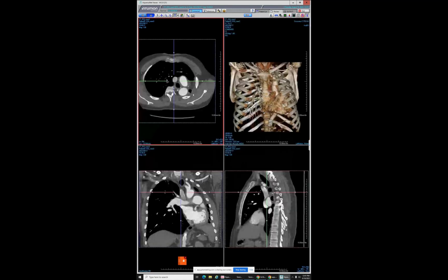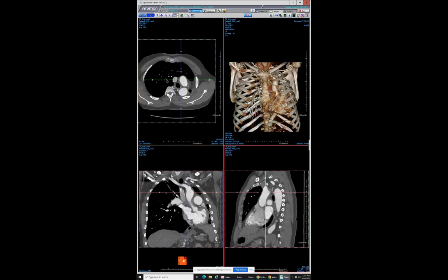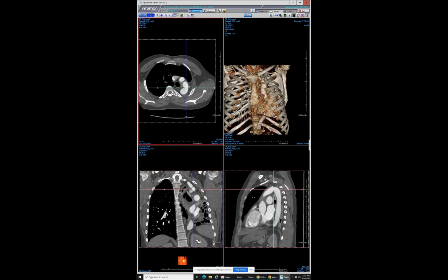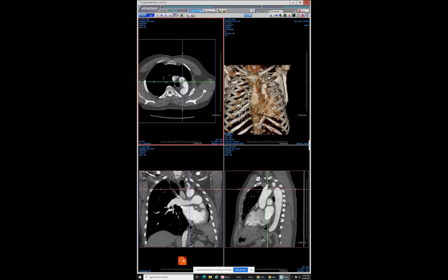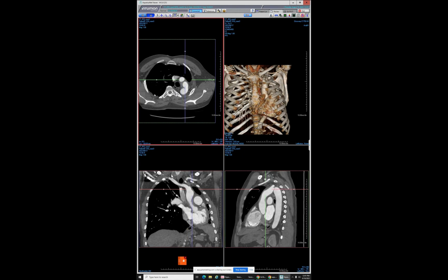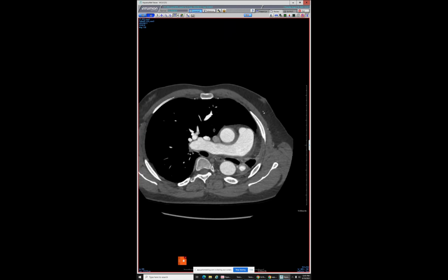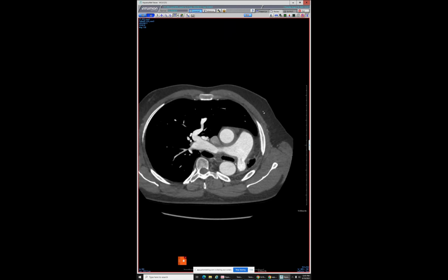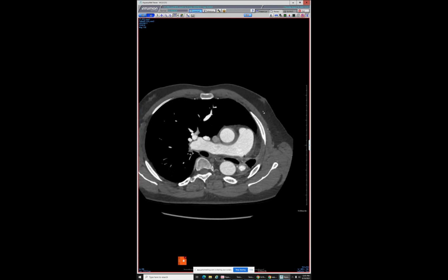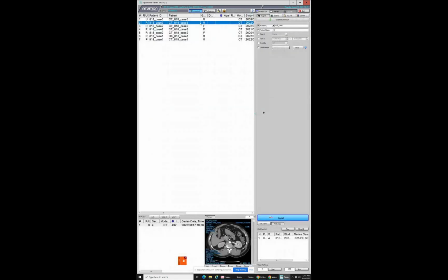Patient also has, and again, I'm not sure how all of this is related, a little bit of a coarc, you can see here. But then on top of that, here is today's study with the coarc, with the destroyed PA. It's not a PA. I've shown cases many years ago as pulmonary coarctations, which this isn't, because those are usually more central. But what I wanted to show is this patient had a study in 2009.